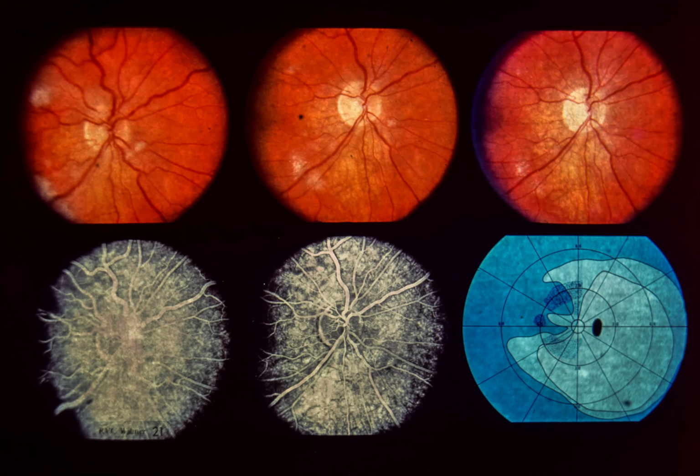Slide 21. Optic disc edema and retinopathy in systemic lupus erythematosus. This 32-year-old female noted sudden visual field loss in her right eye. Her only other complaint was mild aching of both lower legs. Visual acuity was 20/15 OU. The right eye had defective color vision, an afferent pupillary defect, and a superior nasal visual field defect. The left eye was normal.